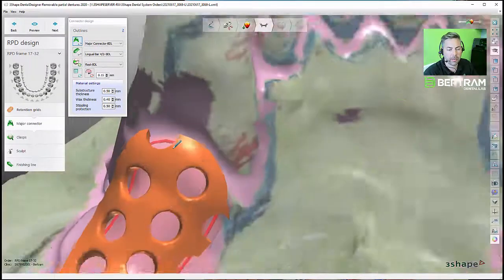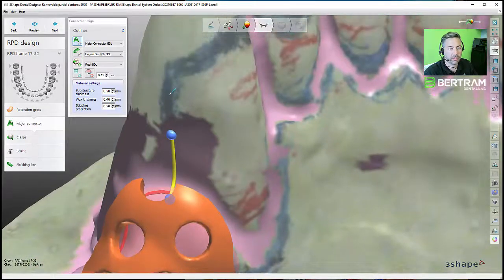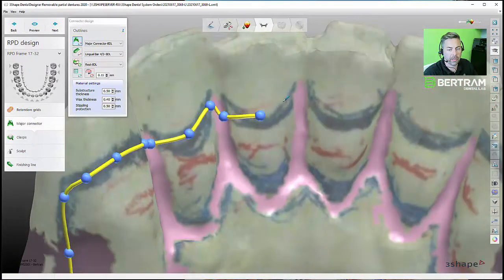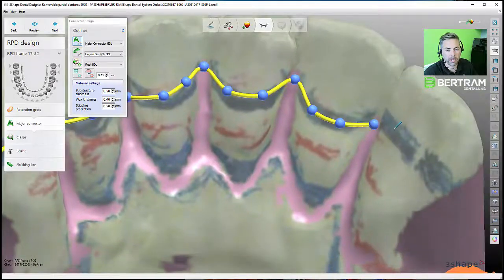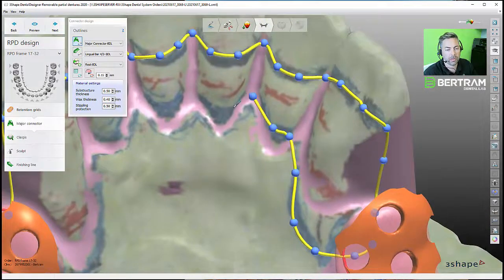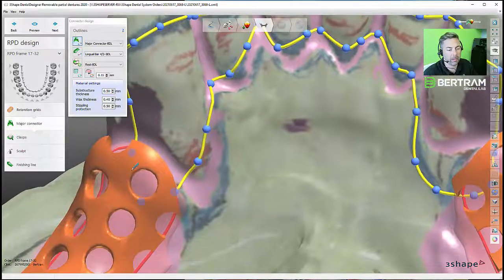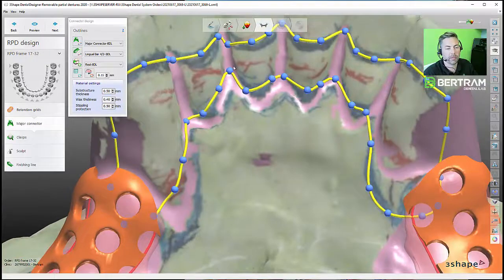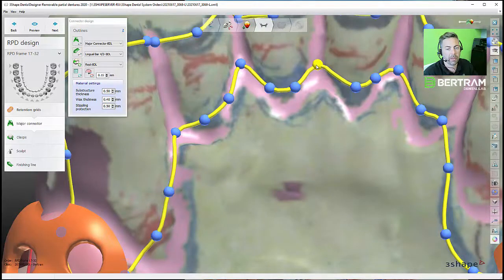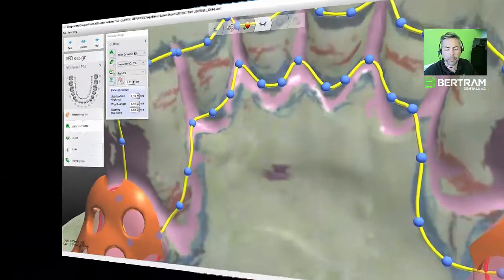All right, so we got the saddles laid down. Now we're going to start with our major connector, our usual 0.5, 0.4 on the wax thickness. I have just the major connector, the first part BDL here, selected, and I'm going to get this laid down. Again, this is a unique case without being a normal lingual plate, where normally we would have that bar piece on the bottom edge. We're not going to have that. So we are going to have some concern with the strength of this without having that bar piece integrated, which is why we have these red marks. Our designers are trying to say, add some wax here, add some thickness, because we want to make sure that we have enough thickness and strength. So that's what that's indicating. I'm going to get this laid down and then we'll pick back up.